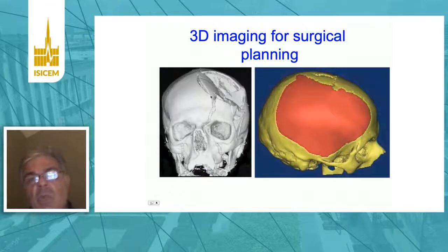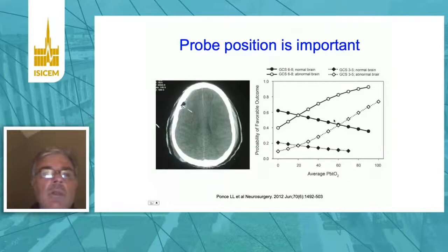A patient with a complex compound depressed skull fracture: 3D CT allows, as you can see on this picture on the right, reconstruction of a preformed cranioplasty to reconstruct the skull. The CT is also useful in patients with monitors.